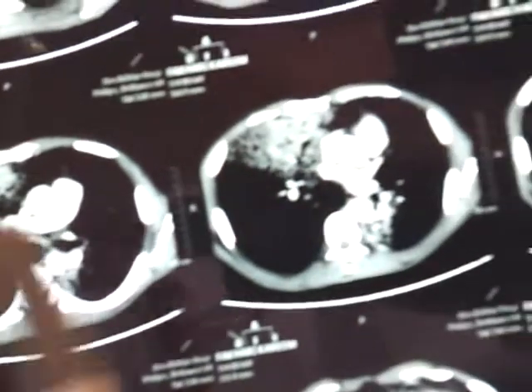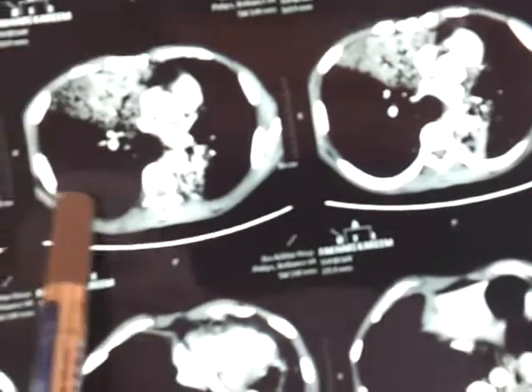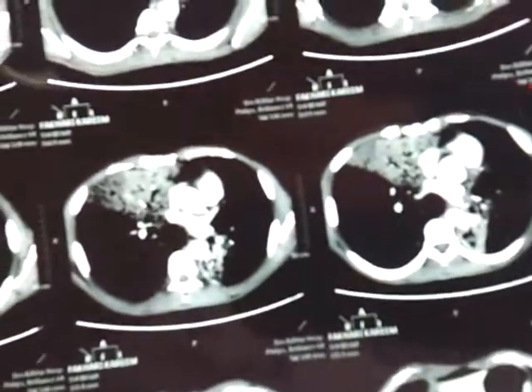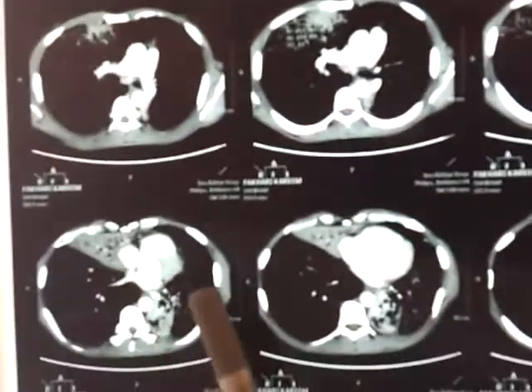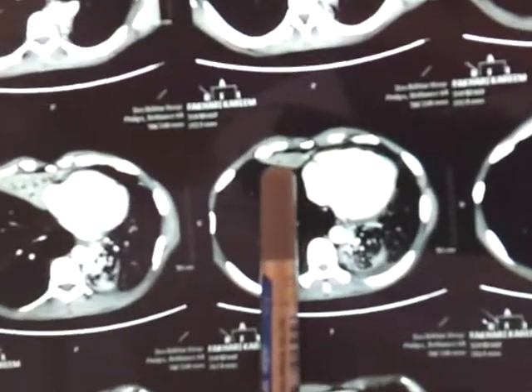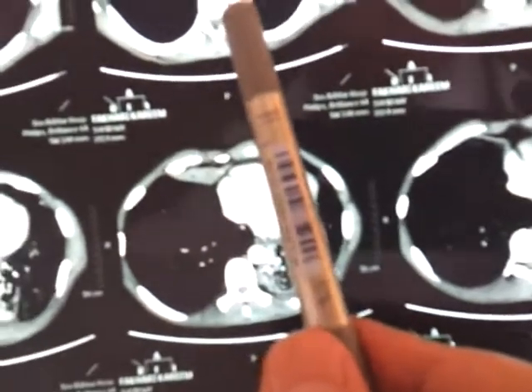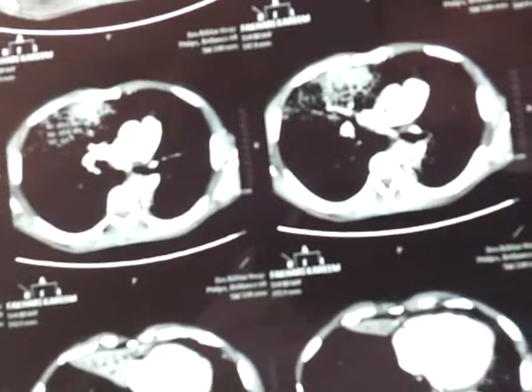And as we said, because the anterior part of the lung on the right side is the middle lobe, therefore this is the right middle lobe, consolidated and collapsed with air bronchogram until it disappears. Also we find there is a starting element of consolidation in the left lower part.